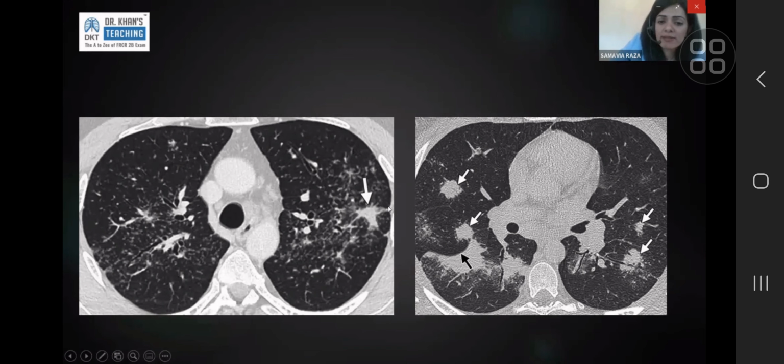These coalesced nodules can sometimes be very prominent. They can be bilateral and they can be quite worrying looking. So then the differential for bilateral metastatic disease comes into play. And sometimes, when you don't see the micronodularity around it, and when you see these bilateral, sizable nodules, it is sometimes worth getting a diagnosis just for reassurance purposes.